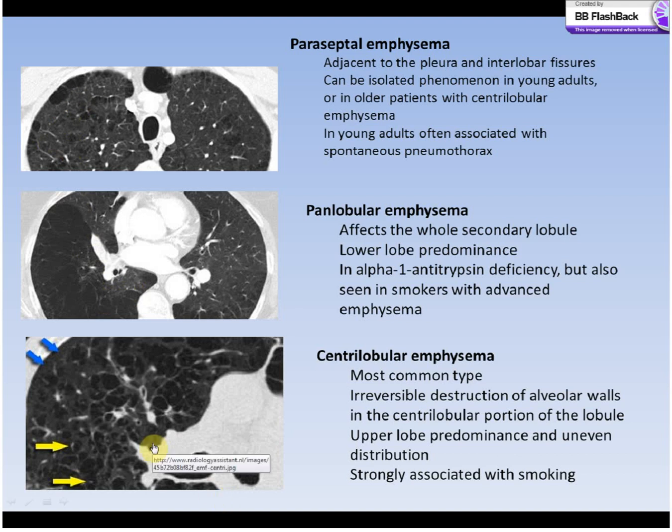And the all too common, or less uncommon, I suppose, centrolobular emphysema, which is strongly associated with smoking, usually with an upper lobe predominance. And as we outlined in the previous slide, there's no defined wall, but it's low attenuation compared to the lung tissue around it.